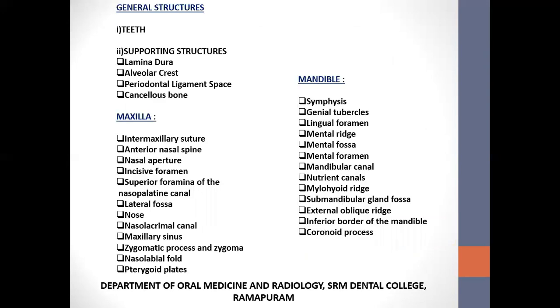So this is just a summary of the outline of the anatomical landmarks in intraoral periapical radiographs. Thank you.